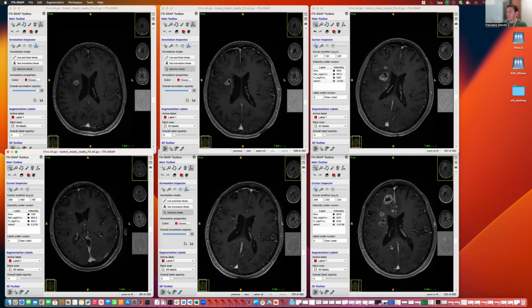After this response, there is a rebound, unfortunately, and the tumor grows again significantly, even without accounting for the specific measurements. From non-measurable, it became measurable, which means it is a progression. At this point, we don't need a confirmation of progression anymore because we already had a PSP event.